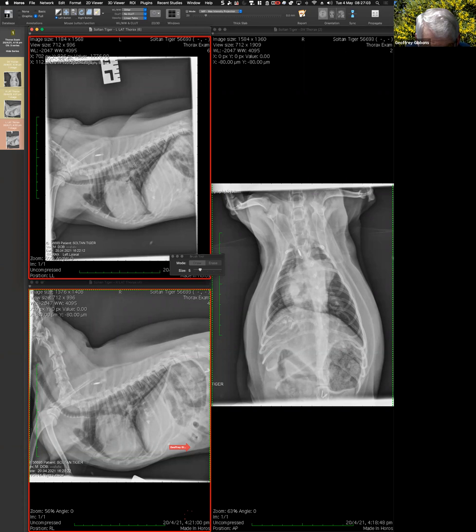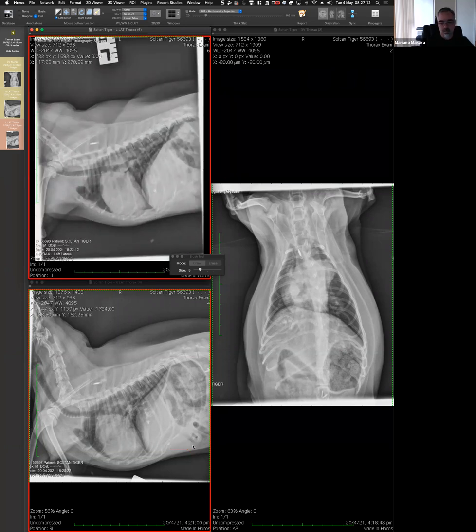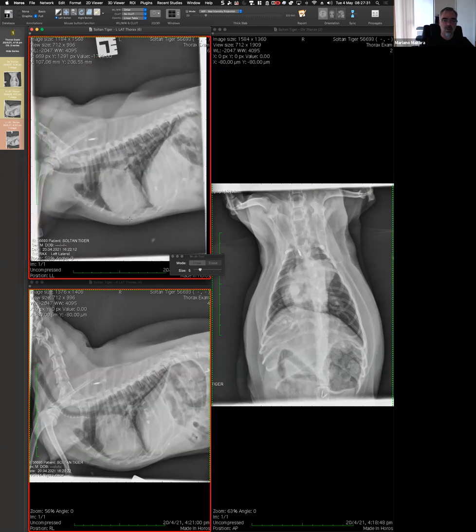Because I can see the liver extending caudally to the rib cage if you take this as the cartilages. I see that. Maybe there's a bit of rounding of the liver. Maybe I agree with that. I would have an issue concluding that there is at least severe hepatomegaly because if you go by the gastric axis, the gastric is not that much displaced. And we know that in older dogs the liver can flip a little bit or rotate and then move caudally to a rib cage.